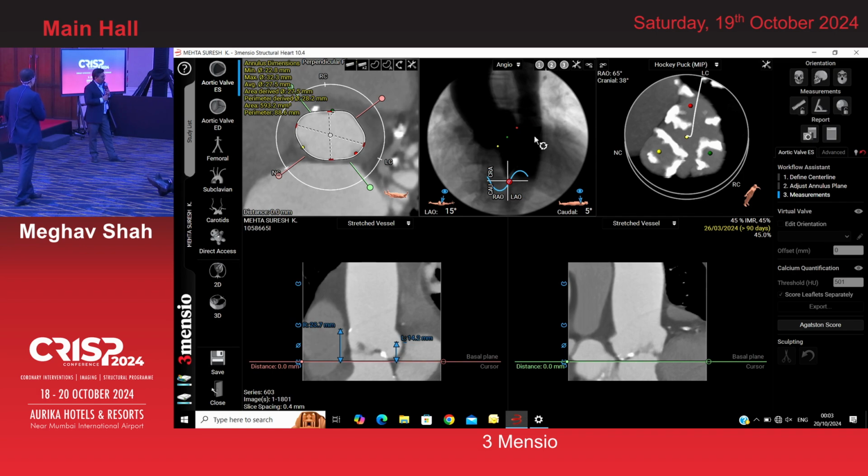So all these parameters are not there. Let me show you a software after this and tell me whether it is manual or almost automatic. Here you can do everything manually as well, and in all the other software too, manually it's the same. I have made an almost automatic version of it. That's what I'm going to show. Okay, good.